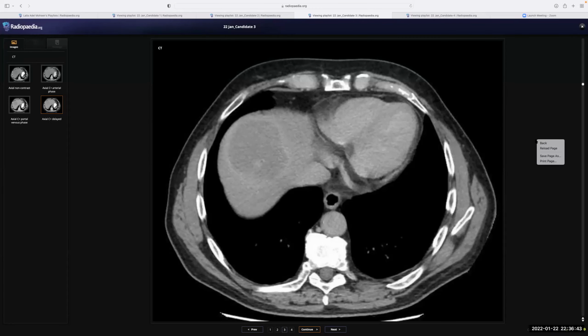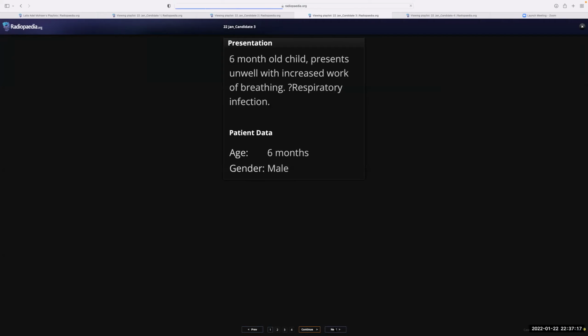Well, it should be discussed in the MDT for the possibility of biopsy of the lesion, if it is FNH, or it could also be hemorrhagic adenoma or cystic adenoma, and for booking an MRI to see the signal intensities of the lesion. But it is a benign outlined lesion. Yeah. Okay, so next case.